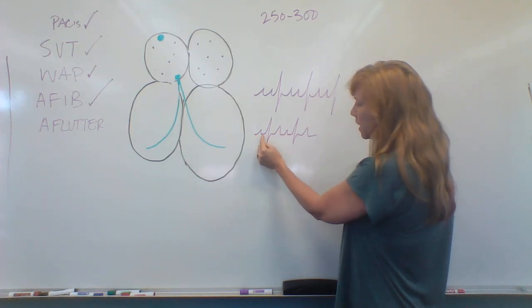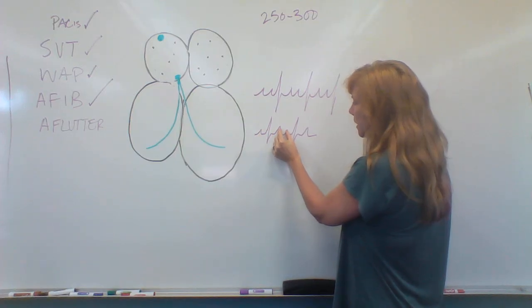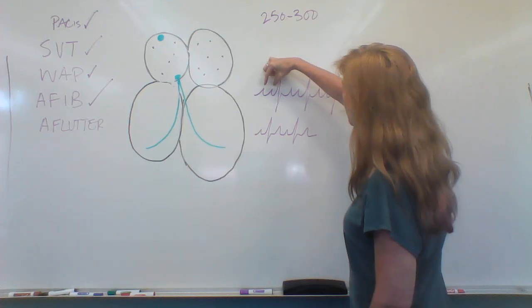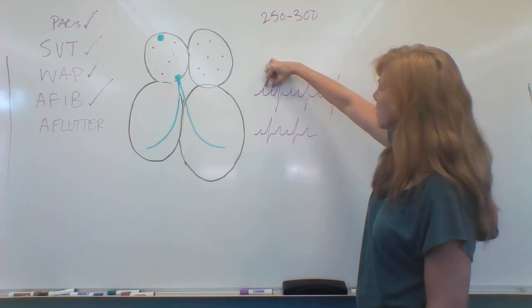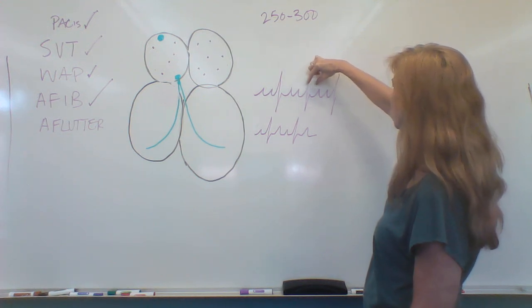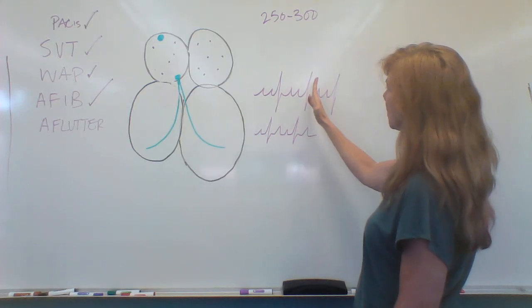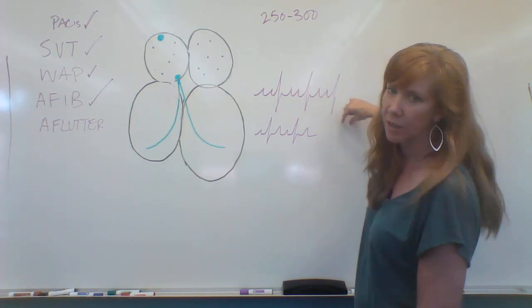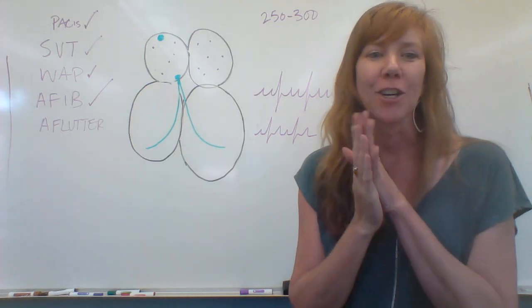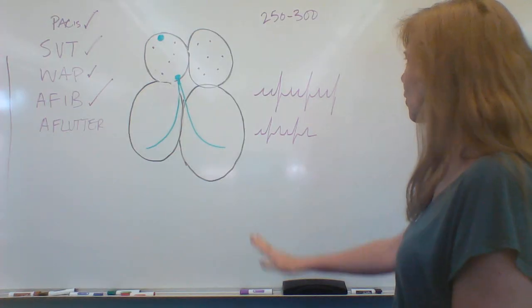And the T should be a little bit larger, and they shouldn't march out. So like the distance between these two shouldn't be exactly equidistant to this one. But flutter waves will be equidistant. If you put your calipers here, the next point would be there. The next point comes out right on time. Exactly there, exactly there, exactly there, exactly there. We say they march without stopping for QRSs, and that wouldn't usually happen on a sinus strip. So if you're an EKG nerd like I am, then you know you do stuff like that. So those are flutter waves.